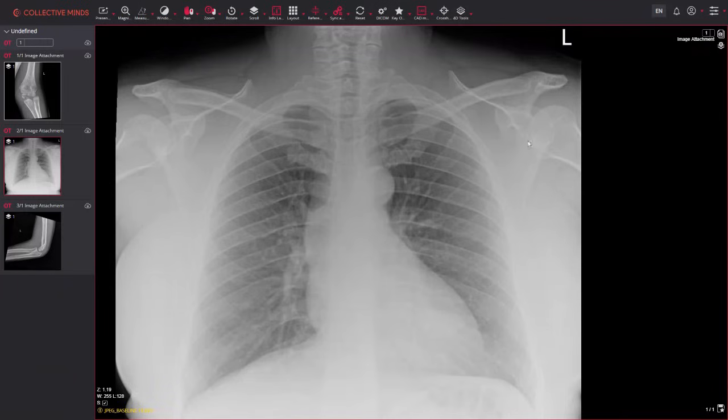And it's important to check the shoulders. So we mentioned the bones, the ribs, but it's not just about the ribs. If it's a trauma patient, could be clavicle fracture, shoulder dislocations. Have a look for any destructive bone lesions at the humeral heads. Really important not to disregard the shoulders. And again, that's why it's important not to collimate too much, because if you collimate too much down here, we're missing all this area here. Could be something there, okay?